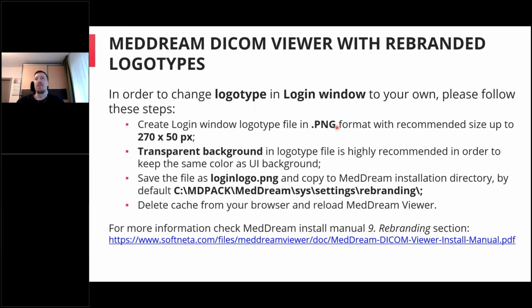In general, it is most popular to have PNG format, and each logo type, either for login or view part, is a little bit different in recommended size, because there is a wider or shorter area where the logo is displayed. We would recommend to use not greater than this size when you are creating the logo.